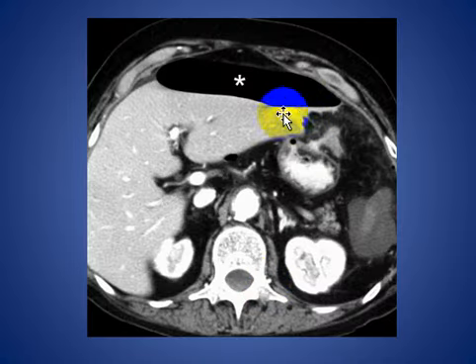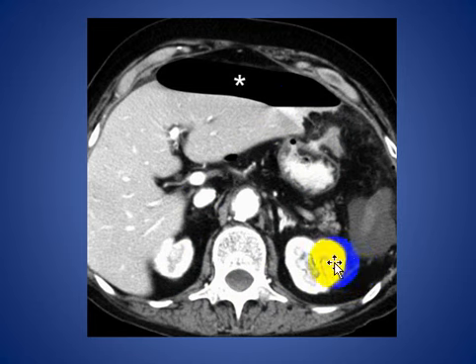And in this CT scan, when the patient is supine in position, the air in the peritoneal cavity will accumulate anteriorly in the cavity beneath the central tendon of the diaphragm in the subphrenic space as in this patient.